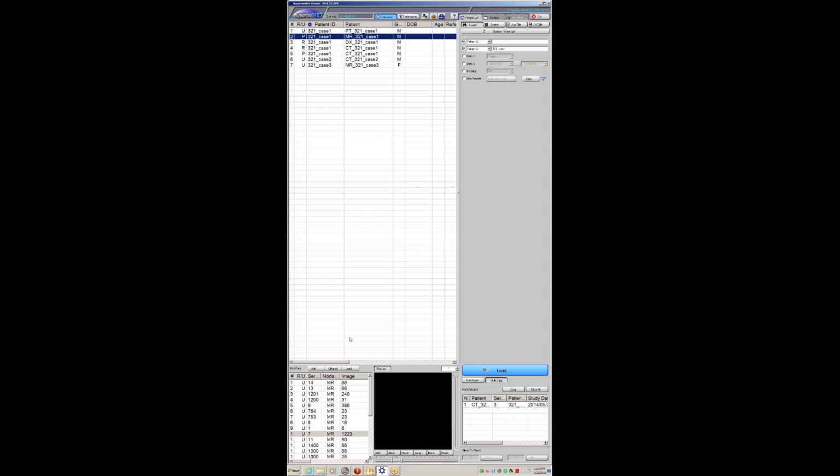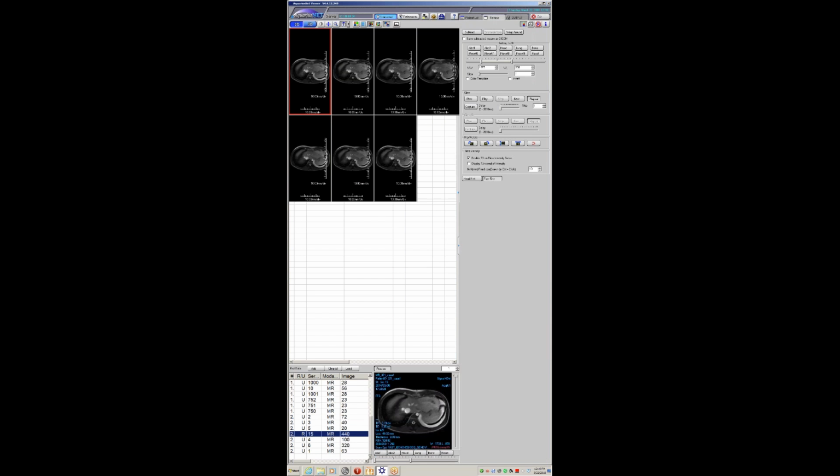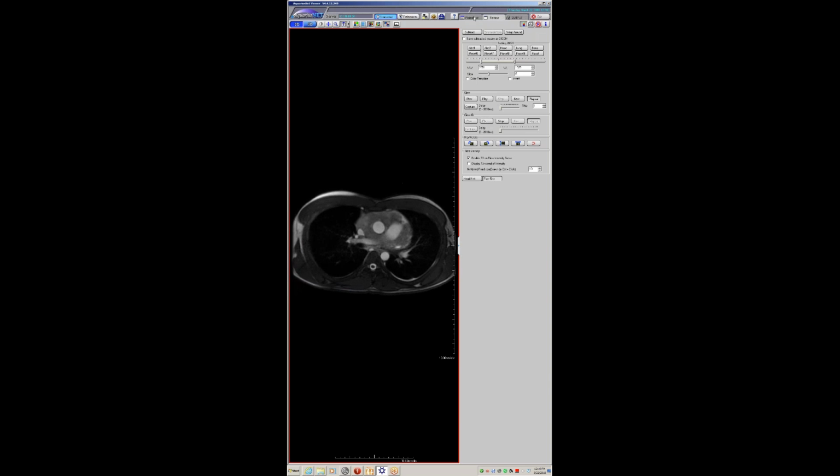We have a very nice MR showing this. I don't want to waste people's time. I'll just quickly pull this up, but come on. But you can see this very infiltrative mass within the pericardium. And we have, again, T1, T2, all that stuff.